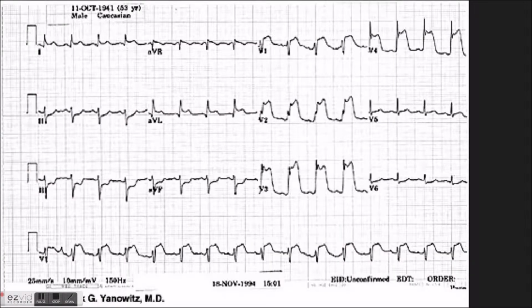Take your time. If you need to pause this video, go ahead and do so. You do not have to be fast. You have to be right. Nobody ever compliments a paramedic or a nurse or a doctor and says, hey, oh man, they read an EKG so incredibly fast. That is never a compliment you hear paid. You hear them say they read one well. So read it well. Don't read it fast.